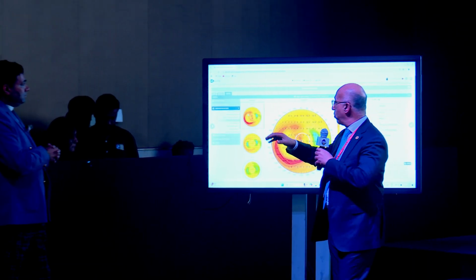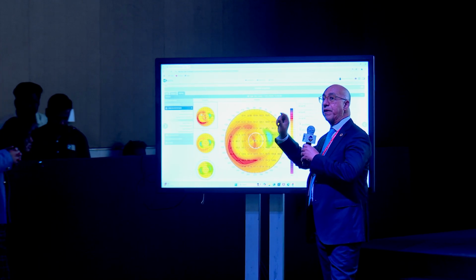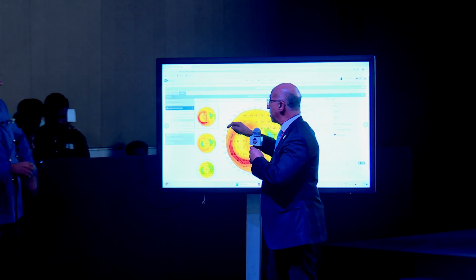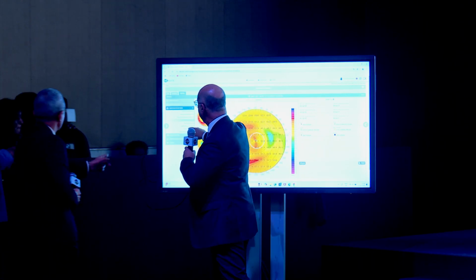totally with an irregular cornea, and you see how the ray tracing of the anterior cornea will look like. But this is totally irregular, of course. But if you go to the posterior, which is again, to go to the posterior, you have to go to the.